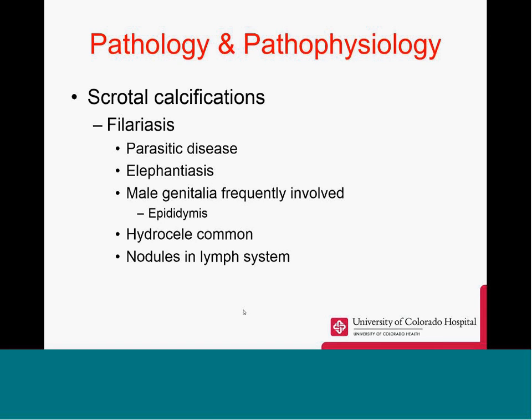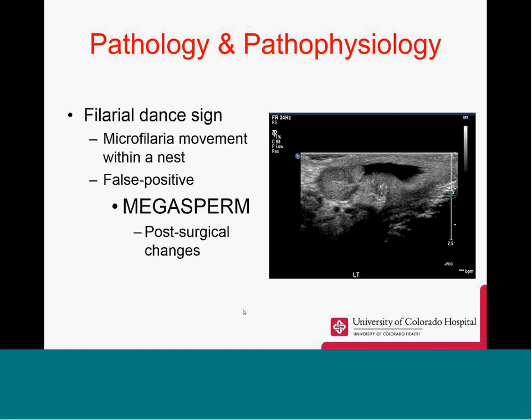The male genitalia are frequently involved. Hydroceles are common. You can also see nodules within the lymph system. These are the burnt out nests of the dead adult filariasis.